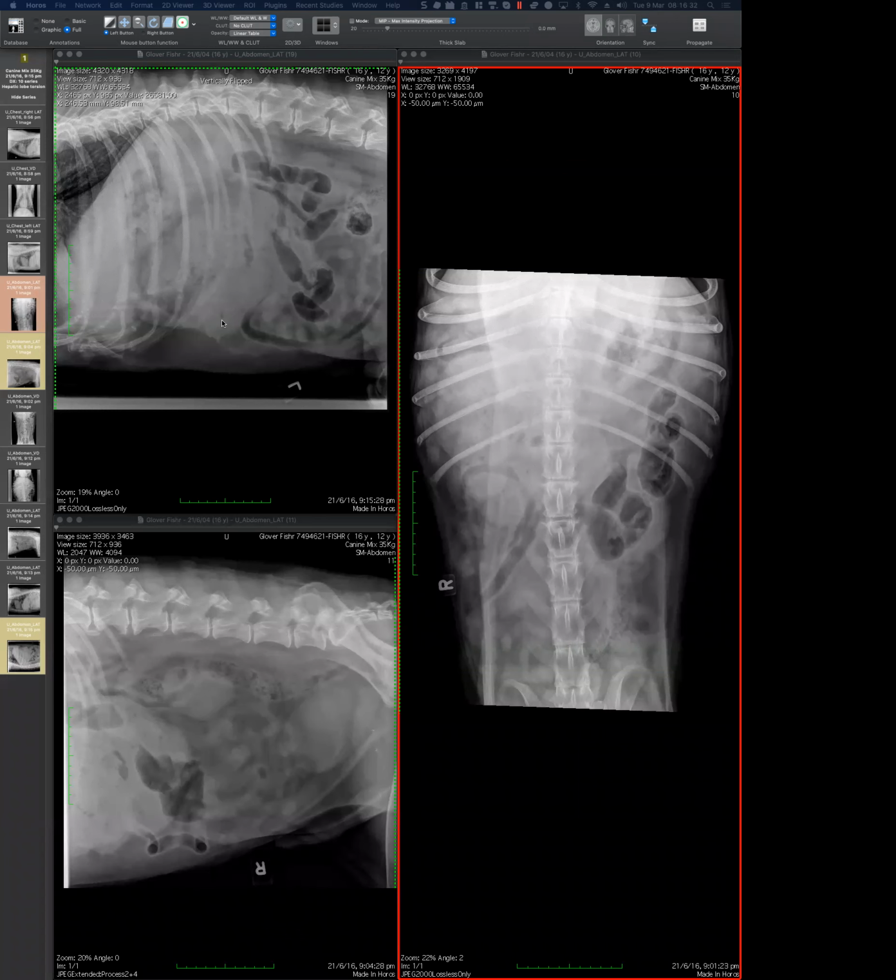I think you can see it because of the displacement of, well, maybe not the stomach. You can see the cardia of the stomach, but the displacement of the intestines and the location of the tiny little gas opacities suggests it's there, I think. Beautiful. I completely agree.